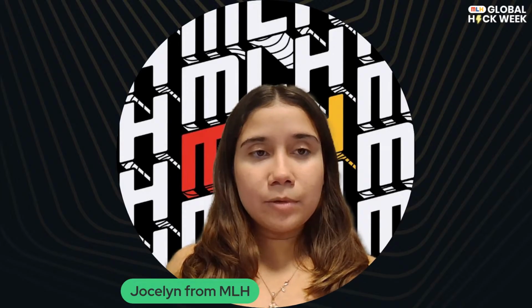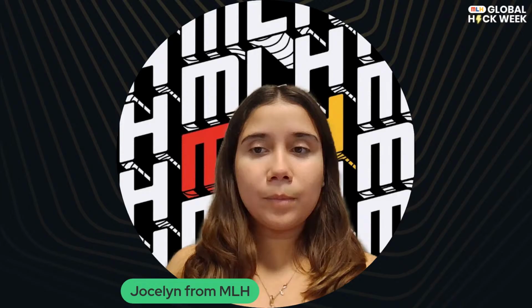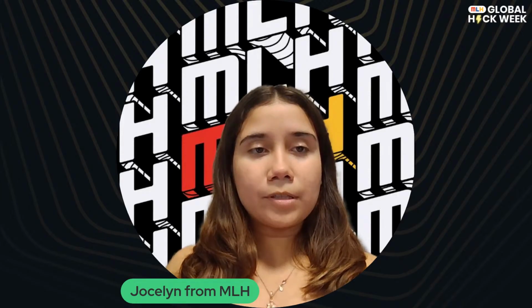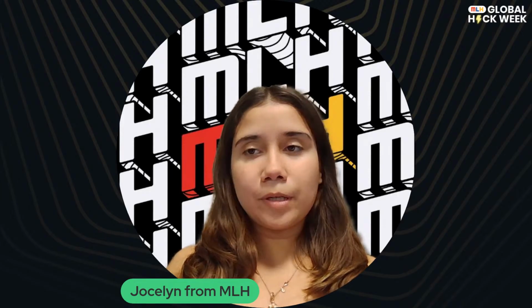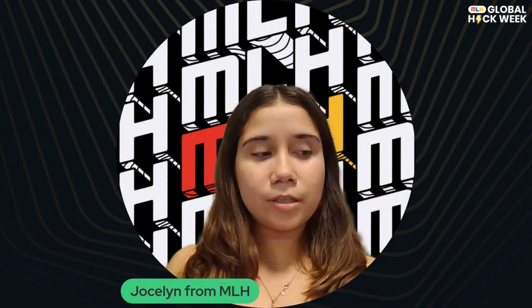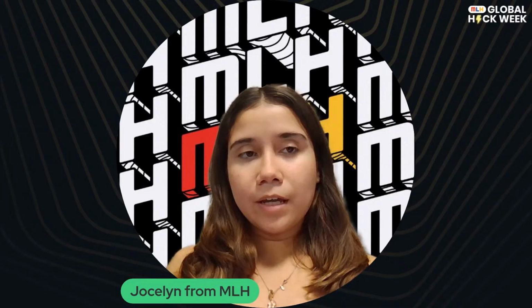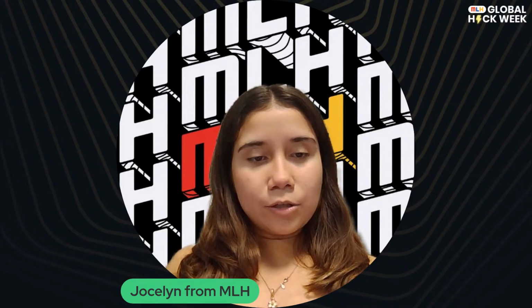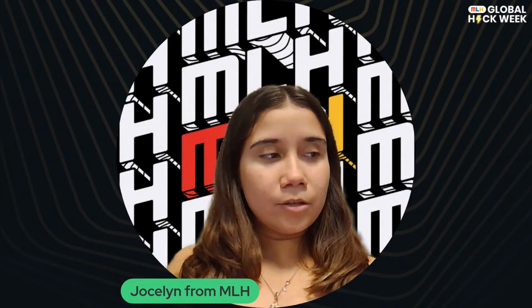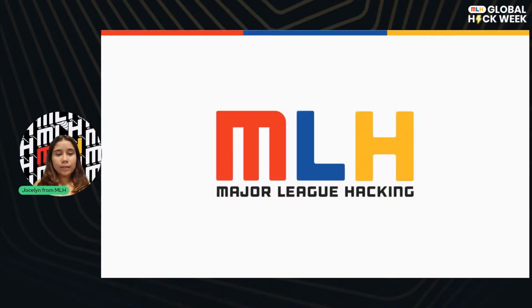And finally, I'll be doing a live demo of an EEG headset that I have here with me, a Crown from Neurosity. I'll be showing you how to pair it with your computer, how to visualize the EEG signals, and then explore one of the features in their live. I'll try to make it as interesting as possible to get you hands-on learning on this.